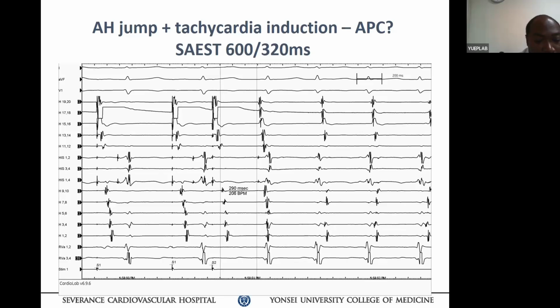So the first tracing, right up front, makes a very unusual looking tachycardia. I think you must point out which one is unusual. If you look carefully, in AVNRT, posterior activation is earlier than HRA. Look at the HRA, where it is. That is earlier.